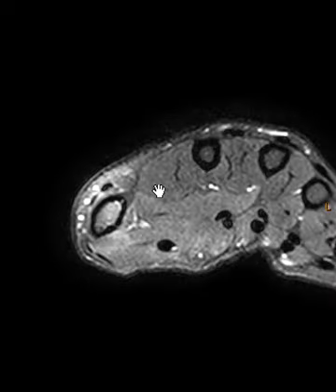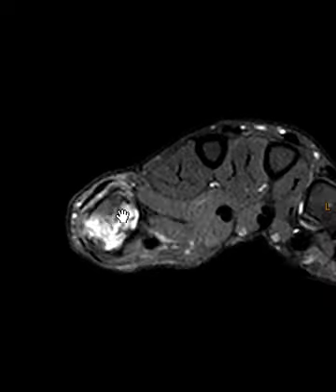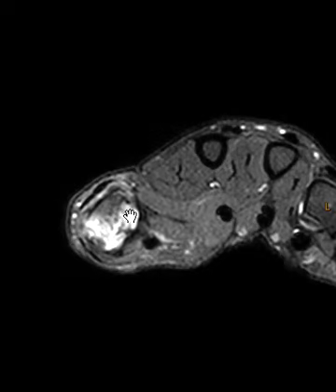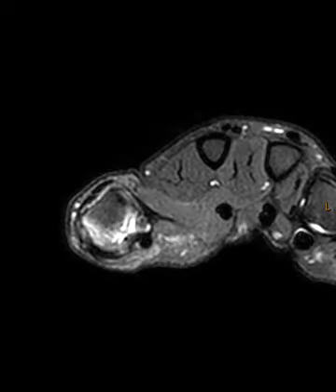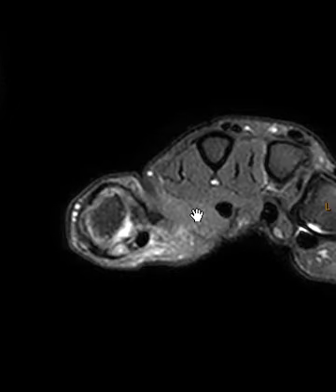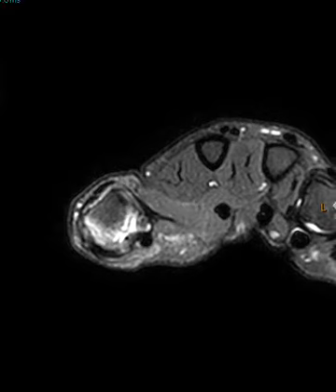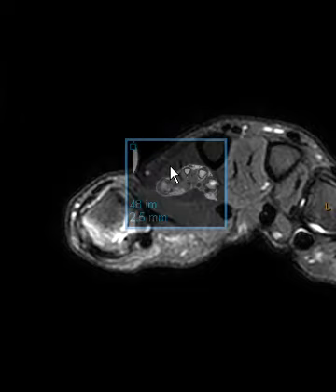Hello, this is Dr. Gay from First Look MRI, and this is a patient who has an injury or fracture of the base of their thumb, and we're looking at the ligaments and tendons to see what is injured here. And really the aim of the video is to show you where the abductor pollicis tendon, ABD, is versus the adductor pollicis tendon, ADD. And so we're going to go to this view right here.